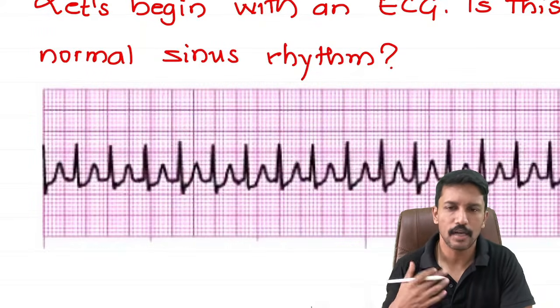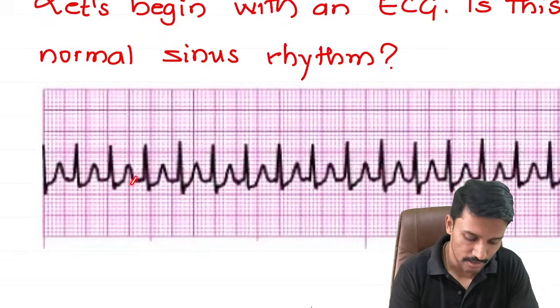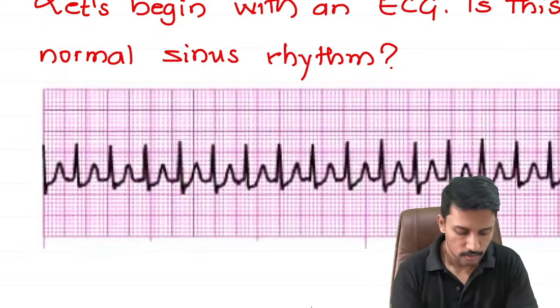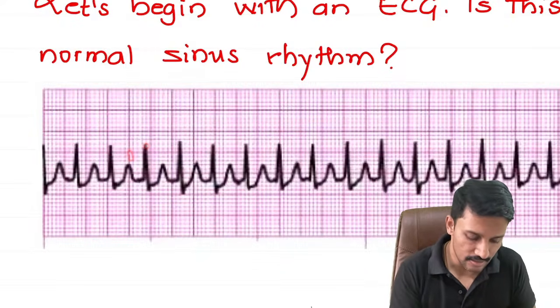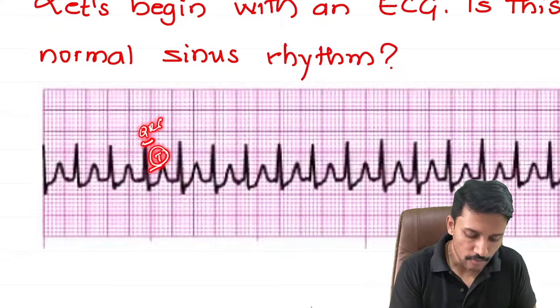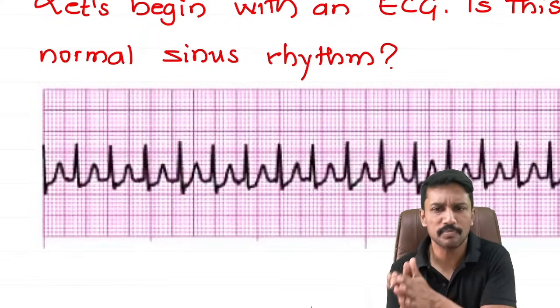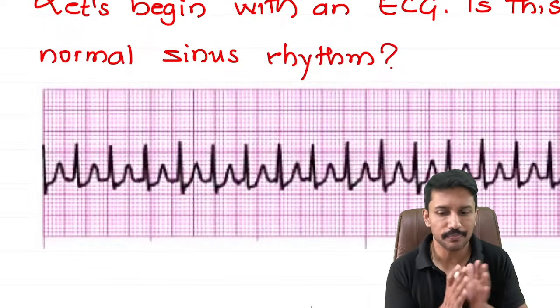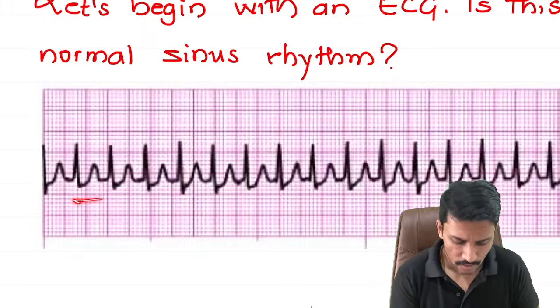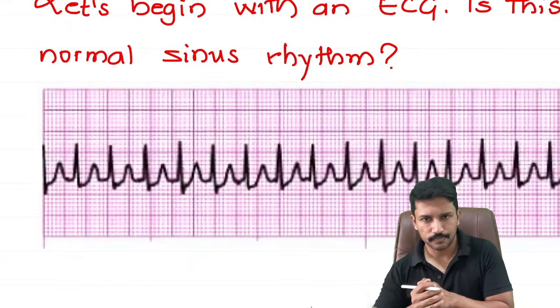So I would presume that if the ventricle was depolarized, it will repolarize, and if it repolarized, there should be a T. So every time I see a QRS, I have to attach one wave as T. If I am counting it as QRS, then the next wave I will count as T. Apart from this, if I find any other wave which I can call P, then I would say P is present, morphologically distinct and identifiable. If I don't find one, I would say P is absent. So in this ECG, we can say that P is probably absent. That is a possibility.